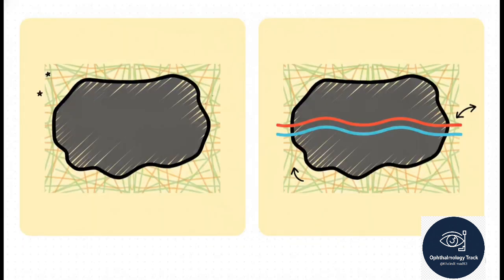So, now that we have our chronological baseline, let's pivot sharply to our very first deviation, hypofluorescence. This simply means the angiogram is too dark. Whenever you see an abnormally dark patch, it means one of two things. Either the dye is there, but it's physically blocked from your view, or the dye just literally never arrived in the first place because of a filling defect.